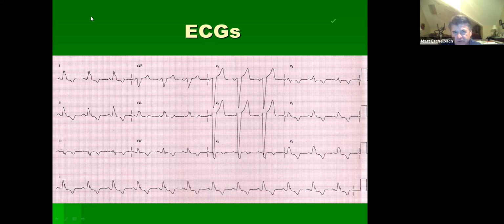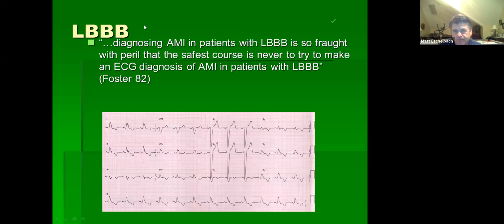And it's supposed to go down both left and right at the same speed, but one takes off a little bit further, and that's why that QRS complex widens. And that's your left bundle branch block because your widening is up here. So left bundle branch block.